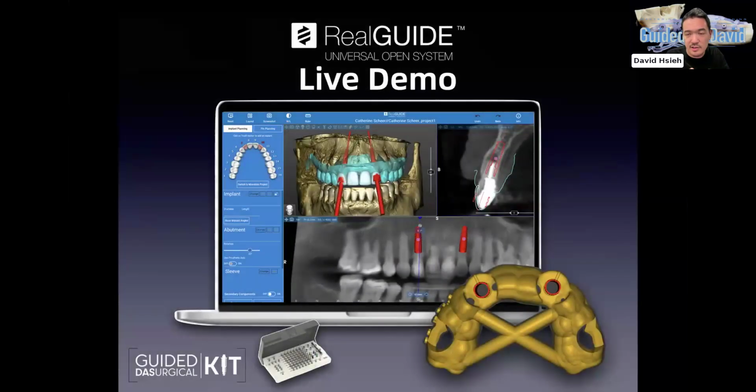Continuing to share, we shared about how to merge. We covered the AI of the merge, the AI of the panoramic curve, and the AI of the bone segmentation and the tooth segmentation, and the struggle between the surgical and restoration, right? Such a struggle, isn't it? And then we learned how to generate the surgical guide for that guided sleeve.